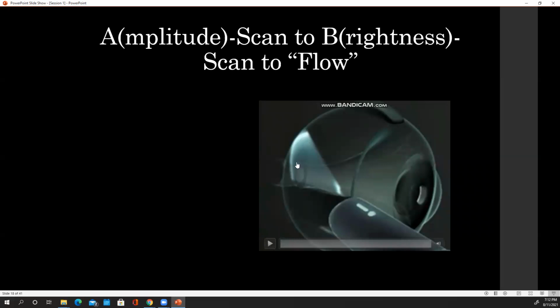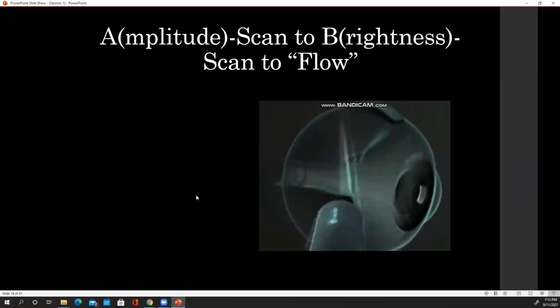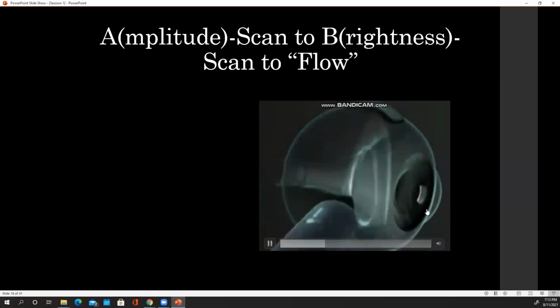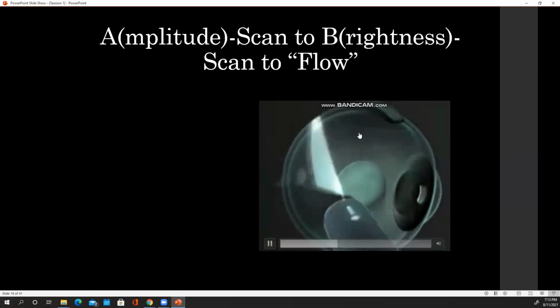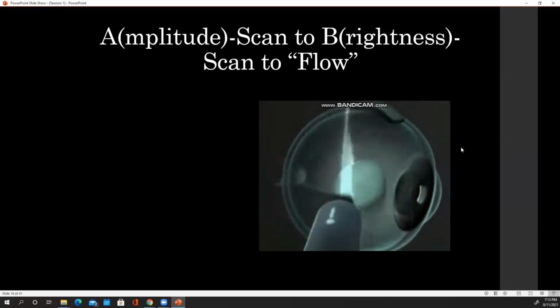Now, if you imagine this slice right here, this is one B scan, like this wedge right here. So it's one A scan, second A scan, third A scan, all the way up to 216, and that forms one two-dimensional B scan. So let's go like this, and you see this is sweeping across the transverse plane. You cut the eye in half, it's sweeping across. Do you see how I would form a cube, a three-dimensional image, if I added all of those scans together as I swept across? Does that make sense? Mm-hmm.